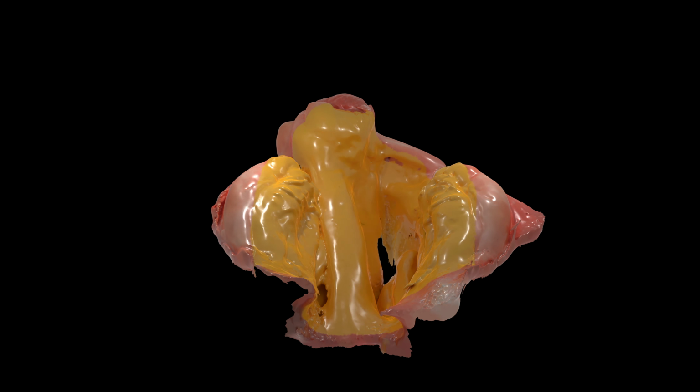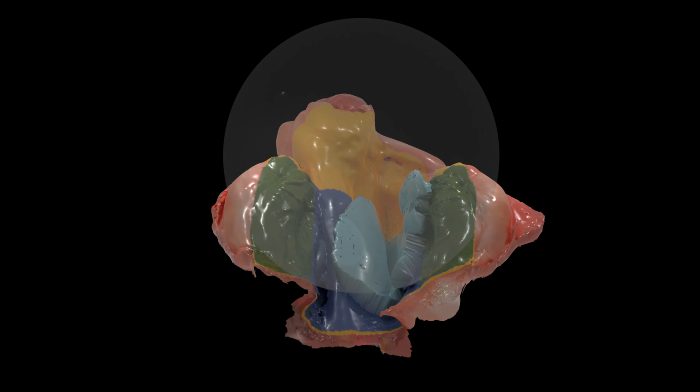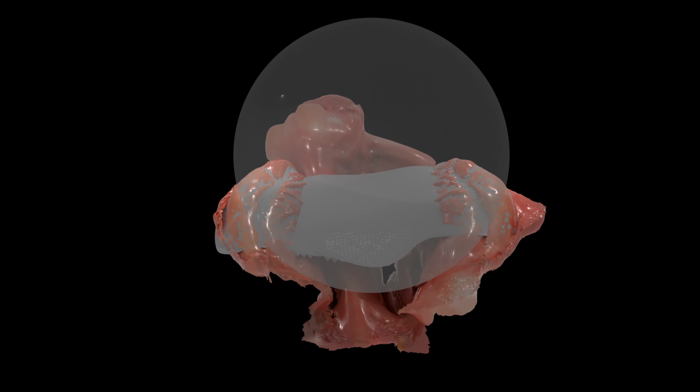Afterwards, the same sphere prediction algorithm applies for approximating a healthy palate's curve, with a safety distance of 2.5 mm kept from the inner cleft tissue. Cleft filling around the sphere, as well as convex smoothing used for volumization, work identically.